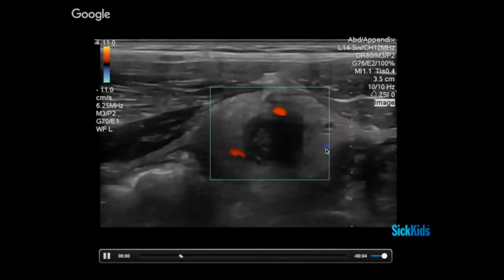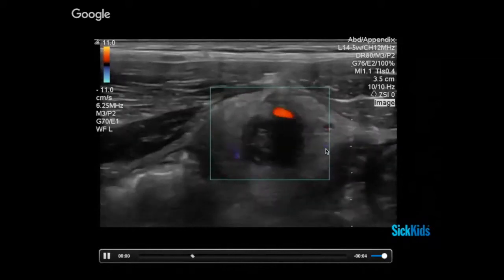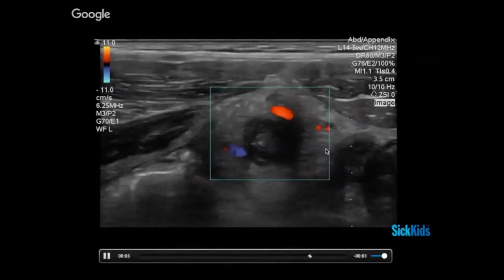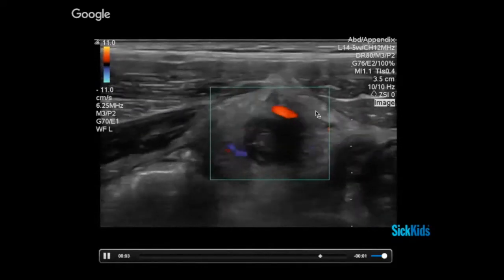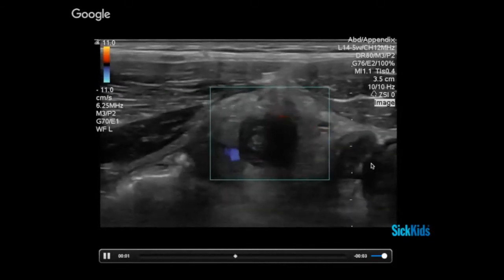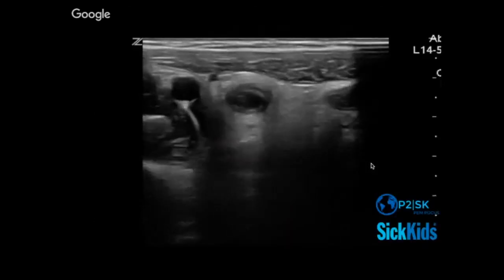So you always have to be a bit skeptical about, well, is it diffuse inflammation in the right lower quadrant, or is it driven by the appendix? And if we were to scan elsewhere and not find as much of this hot fat anywhere except in this halo around the appendix, then that's another piece of the puzzle, as you might say.